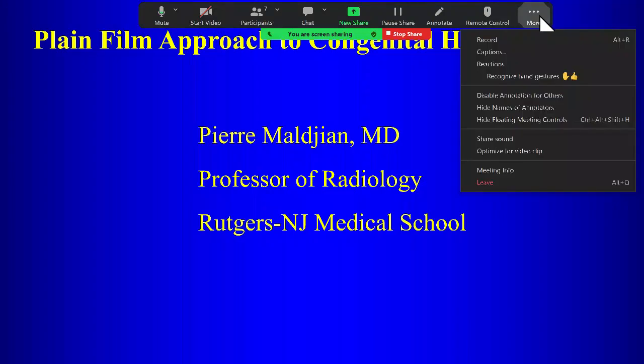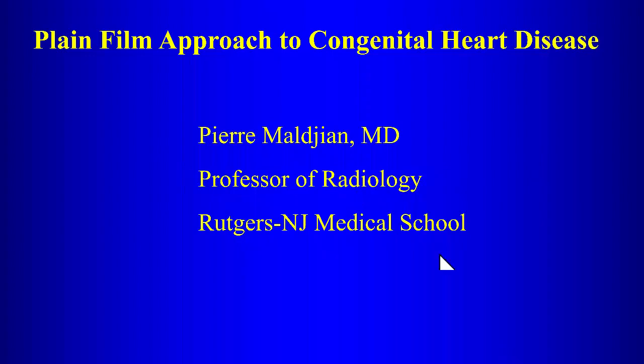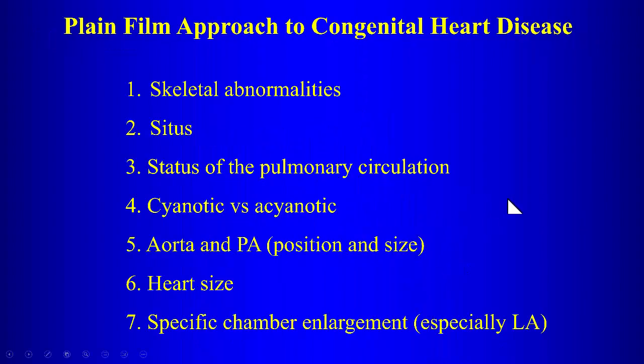All right, so today we start our section on congenital heart disease. In many ways, this is probably the most important lecture because it gives you an overview of the things that we're going to be talking about. So here we'll talk about the plain film approach to congenital heart disease.